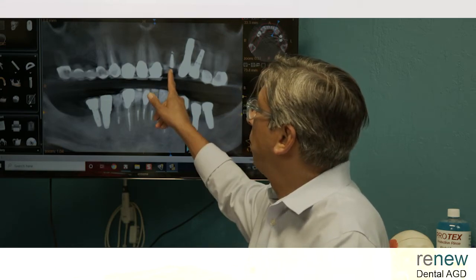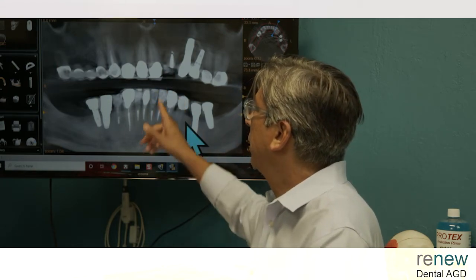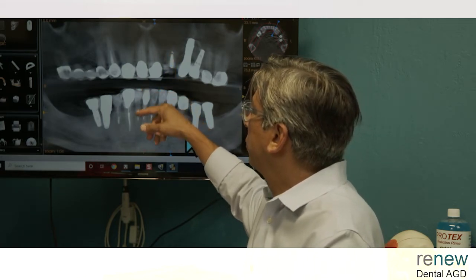Here's a problem I actually see a lot, and I wish endodontists or general dentists would not do this: place these posts in there. That's horrible because that typically fractures the tooth up here. Here it fractured off the top. Those aren't helping anything. So I would say, let's get rid of that.